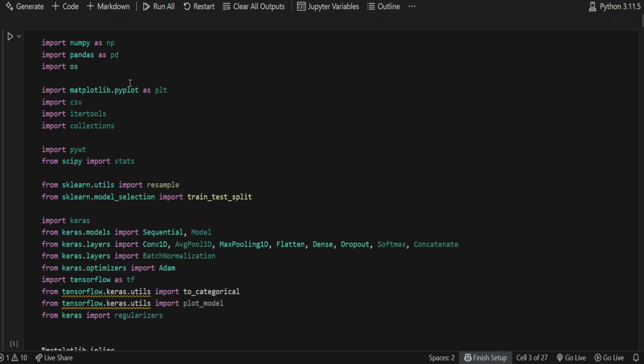So we will discuss what the modules are and what things are used for the ECG training module. We will use the MIT-BIH database, basically one of the best AI and health research datasets. We will use five libraries here.